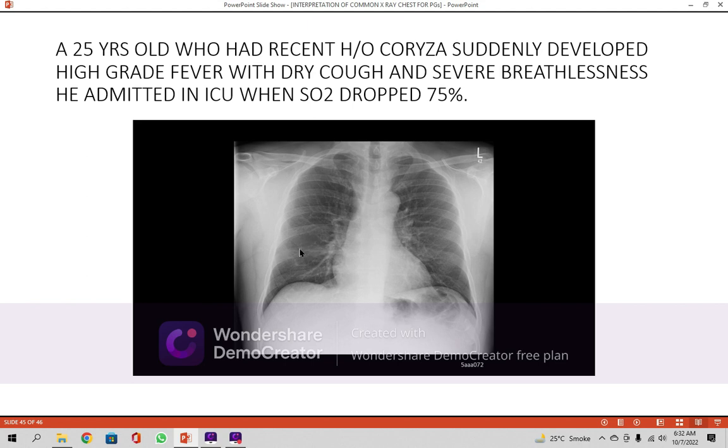These are the markings which are coming out. They are not bronchovascular markings, but fine striations, I would say. Striations coming out from here also. Because the bronchovascular marking definition is that it should come out from the hila. It has a broad base, and when it moves towards the periphery, it gradually tapers and ends here, and not here.